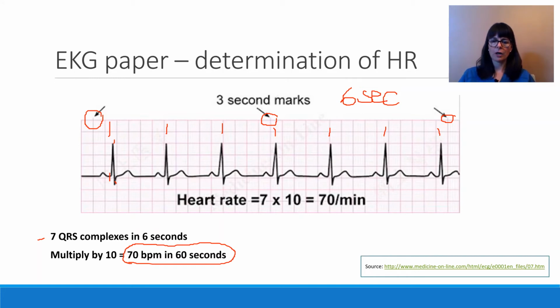Of course, if the heart rate gets irregular or there is a pause, for example, if the dysrhythmia includes a pause or something else is going on with the conduction system, the rate might not be regular, so this calculation might be off, which is when you might need to look at a bigger strip, maybe a 12-second or 18 or 24-second strip to get a better understanding. But when in doubt, you would always get a 12-lead EKG anyway and not just a quick telemetry printout.